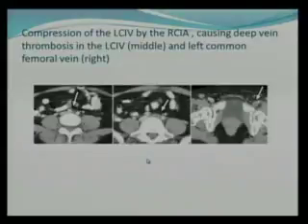So this is the compression. We'll look at it minute by minute. Okay, let's see. So right here, what is this structure? Does anybody know? Yeah, so a very easy way to identify artery and veins on CT is that the artery usually will maintain a robust circular shape. The normal veins will be oblong, rectangular, trapezoid, rhombus, whatever you say. They may not be robust and circular. They may have a more sausage-like appearance.